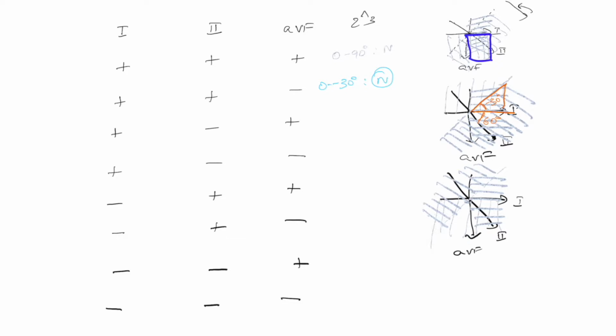Notice how there is actually no overlap of all three zones, so this is not possible. This permutation and combination is not possible, and if you see this, something is wrong with the way the EKG was done. So physiologically, as well as by the laws of physics, this is just not possible with the conventions we've adopted. So now let's look at the fourth scenario.